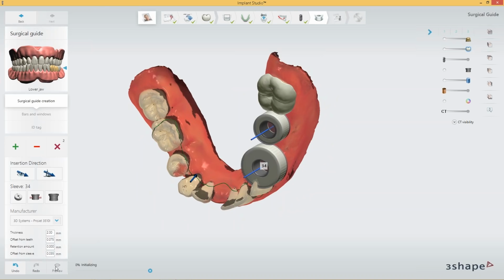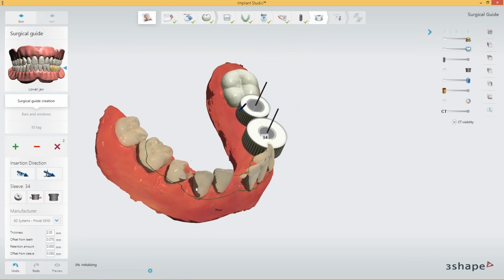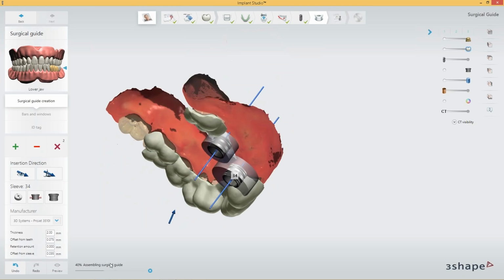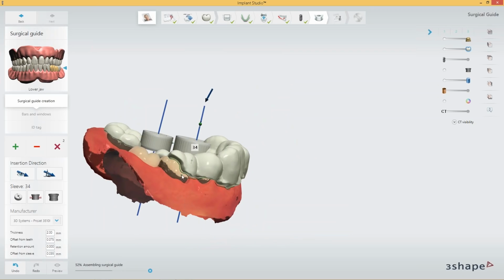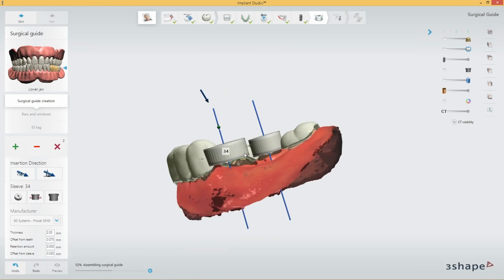If we don't fix it and try to preview it, oh, now the software is so forgiving, so it actually lets me do this. Sometimes we get these small tweaks and wrinkles and so on, and then it's difficult for the software to actually design or produce the guide. So it tells me that I have to straighten them first, but this was no problem at all. I can actually go down a little bit more here. Good. And already now we see this design that I wanted high.